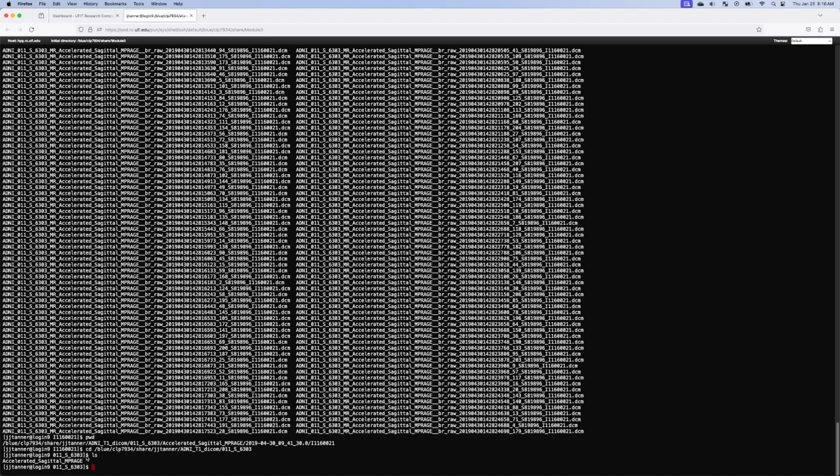So now within here, we're going to run the dicom to NIfTI. And to use this, we have to load the software to make it available. So we're going to load 3 software packages though. First one, we're going to module load. That's how you load things on HiPerGator and many other of these big high performance clusters. So we do this module load. There's spaces in there, module load. And the first one I'm going to load is something called gcc/5.2.0. Now, don't worry about what that is. We're just going to load it.